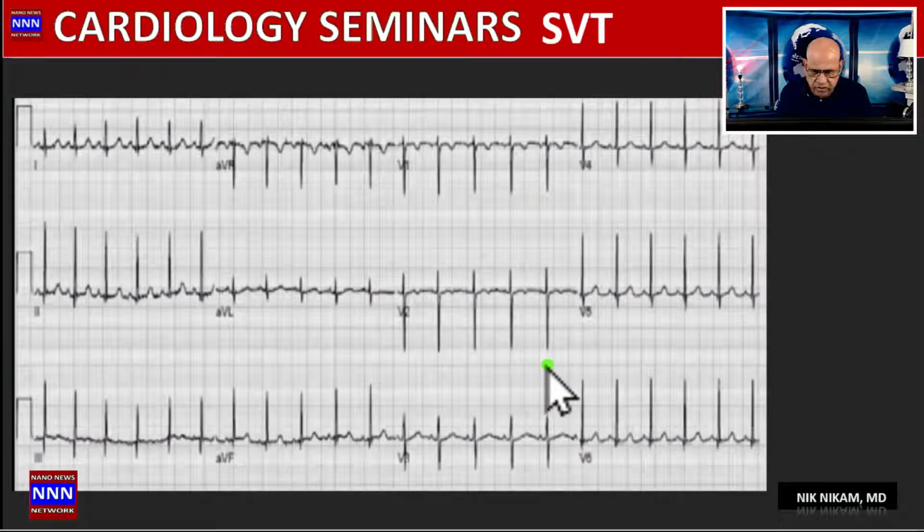What do we see here? So here we have a regular heart rate, which is approximately 160 per minute, 150, 135. So we have a regular P wave before each QRS complex. The QRS complexes are narrow, and we can follow the P waves in most of these leads. So we are dealing with a sinus tachycardia. The sinus tachycardia is anywhere between 100 to 160 beats per minute. Junctional tachycardia can also be between 100 to 200 beats per minute, but generally you wouldn't see this regular P wave with a regular PR interval in a junctional tachycardia. We see some non-specific T wave changes here.